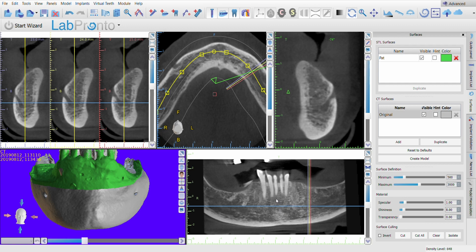By the way, I have said it in the past in other videos: you do not want to sit in front of the computer without having a mouse connected to your computer, because it will be very, very difficult. So if you're coming to the course, please make sure that you have the right computer. You have the Blue Sky Bio Planner, which is a free planner, on your computer, as well as a mouse.